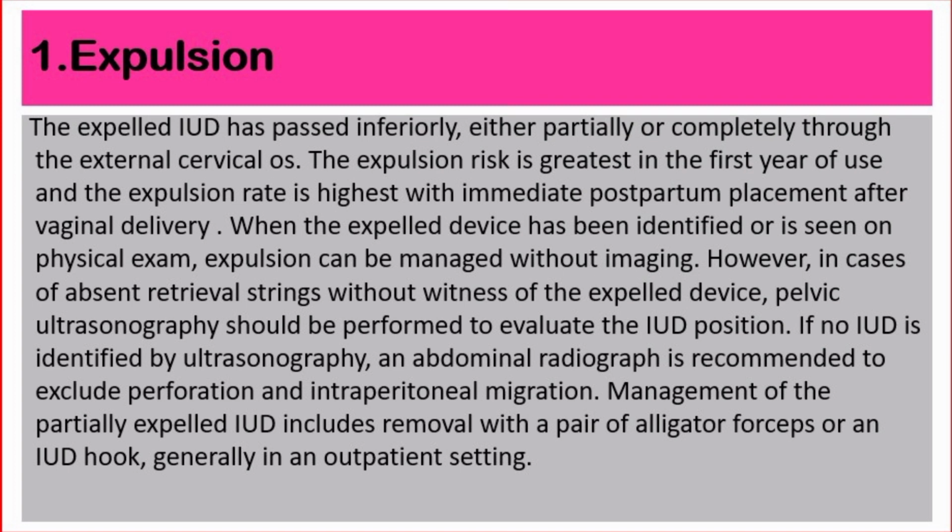Number 1. Expulsion. The expelled IUD has passed inferiorly, either partially or completely, through the external cervical os. The expulsion risk is greatest in the first year of use, and the expulsion rate is highest with immediate postpartum placement after vaginal delivery.